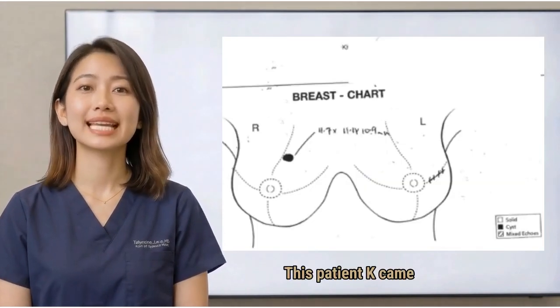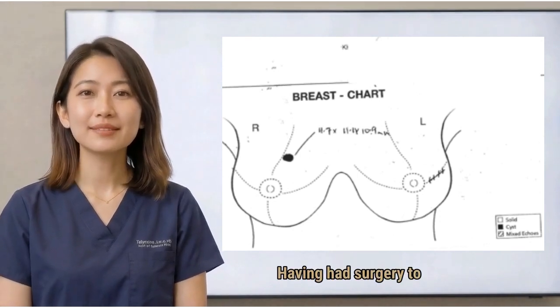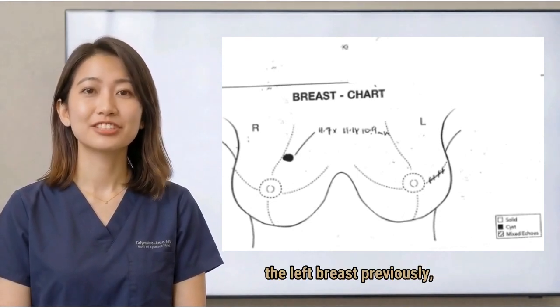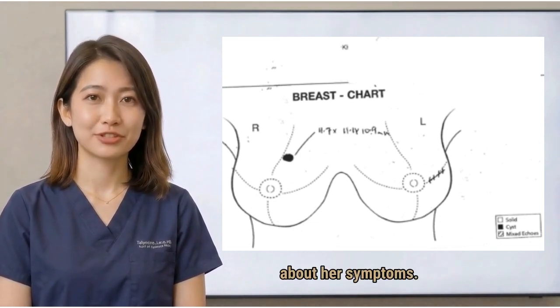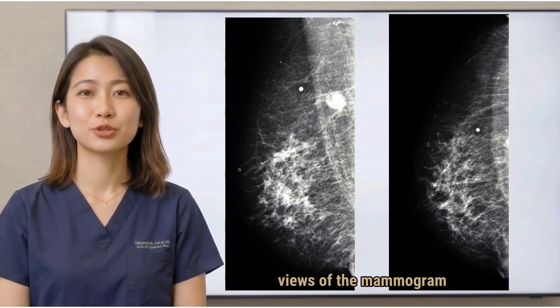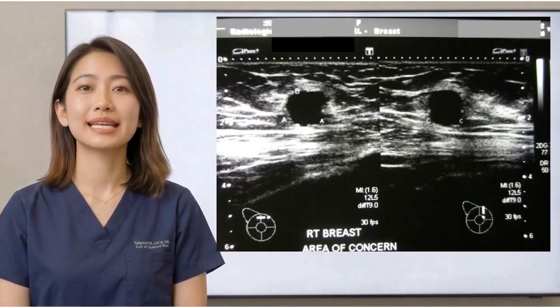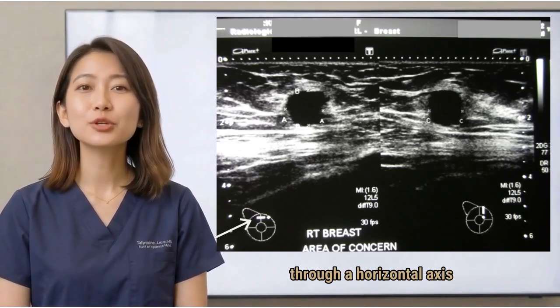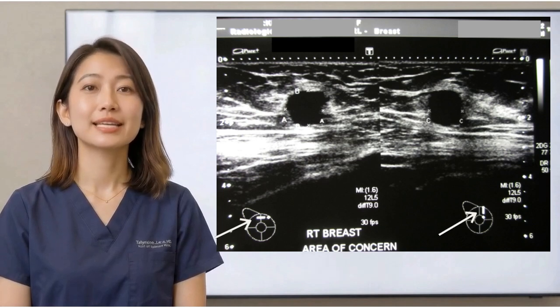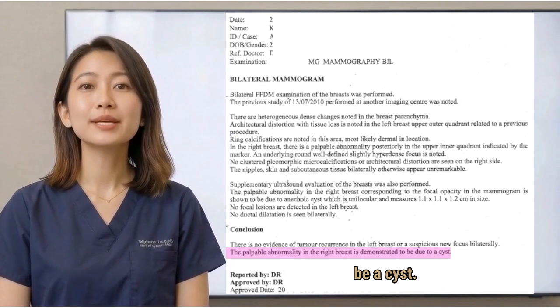This patient K came to see me for a lump in her right breast. Having had surgery to the left breast previously, she was very prompt to see a doctor about her symptoms. These are the two views of the mammogram for her right breast. And here are the ultrasound images of her right breast lump, one through a horizontal axis while another taken in a vertical plane. You will recall that this was reported to be a cyst.